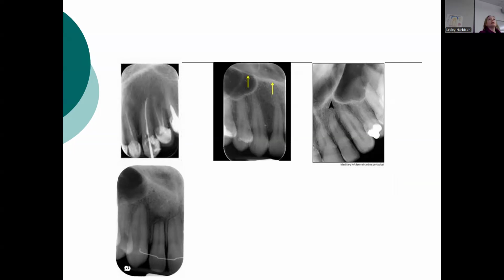And there's not as much space, so it's really hard to get. You want to get your canine centered, but your vertical angulation can be steep. You can be more posterior than you meant, or more anterior than you meant. So the images can look all over the place, and on a human it's going to be even more variable because people have different shaped palates and all of that. So you can see how it's really different.